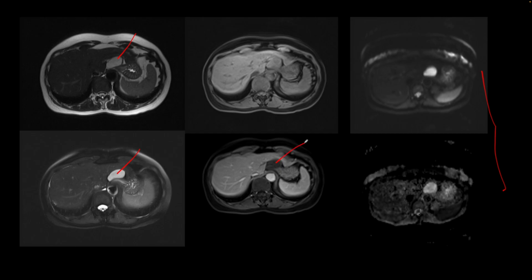And so these findings suggest that this cystic or simple appearing cystic focus in the gastrohepatic space is most likely a foregut duplication cyst. This is a common location for them, and they are generally simple in the sense that they will have a thin wall with no septations, minimal peripheral enhancement, no central enhancement.